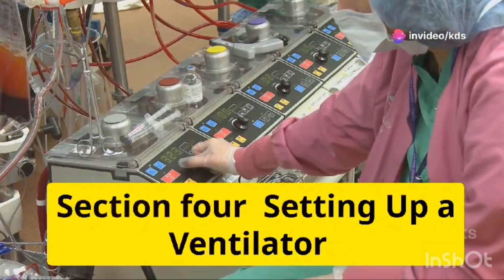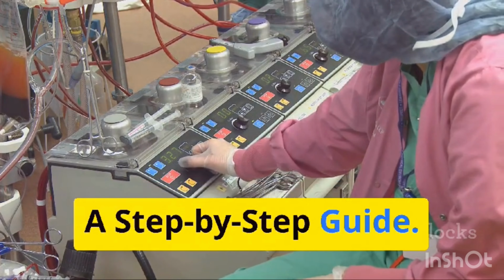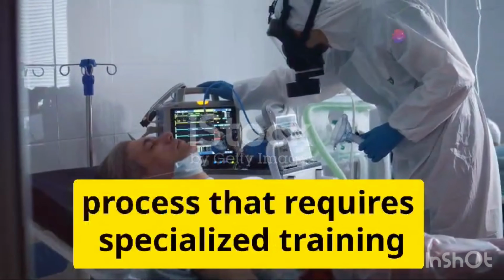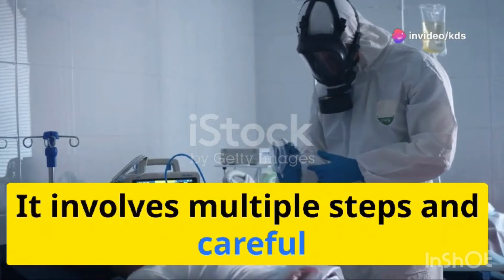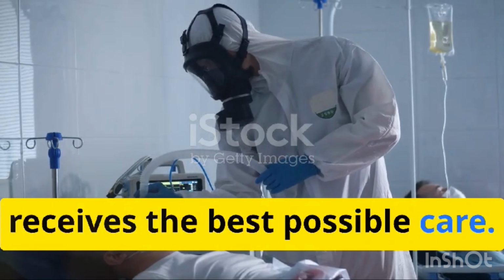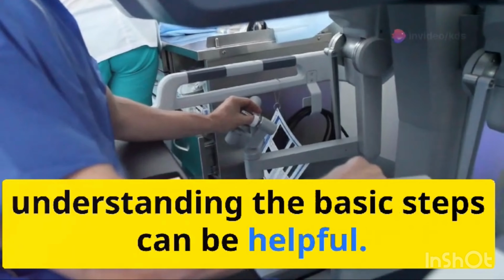Section 4. Setting up a ventilator. A step-by-step guide. Setting up a ventilator is a complex process that requires specialized training and expertise. It involves multiple steps and careful attention to detail to ensure the patient receives the best possible care. However, understanding the basic steps can be helpful.